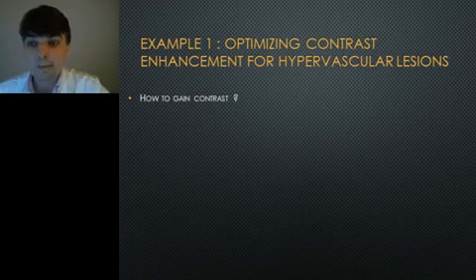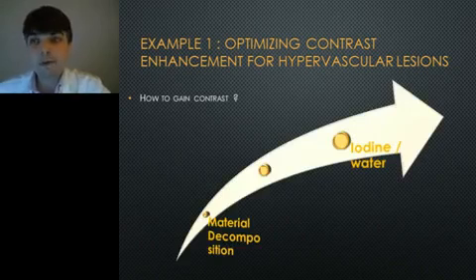We are still in Hounsfield unit maps. This is still a virtual monochromatic energy level, and there you have seen the segment 6 lesion. You can see it so much better with low energy levels. So you've improved the contrast. Now maybe you could go differently if you want to optimize the contrast. Maybe you want to reconstruct with a different approach and leave the density map and go maybe with, okay, let's see how it shows up with the iodine concentration or the relative iodine concentration within that same lesion.